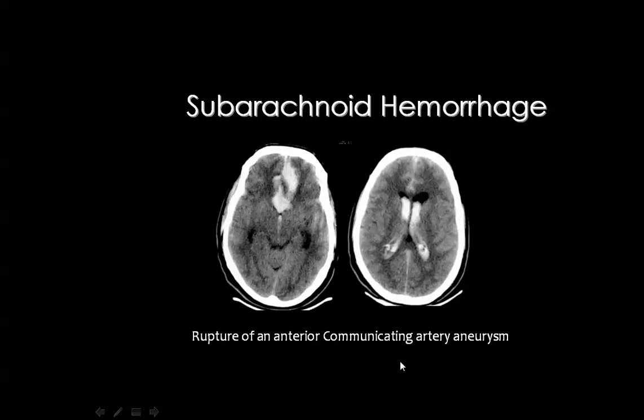One of the common causes of subarachnoid hemorrhage is the rupture of an intracranial aneurysm, besides, of course, the traumatic insults as well. Then you can identify the site of the bleeding aneurysm. I will discuss this in full details in the lecture of intracranial vascular malformations. You see the site of the ruptured aneurysm by an area of hemorrhage surrounding actually the site, and this is the commonest site for an anterior communicating artery aneurysm. Then here you can see the hematoma, and also you can see hemorrhage inside the ventricles.